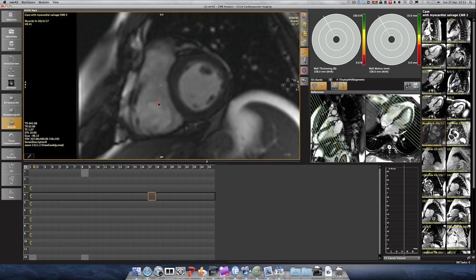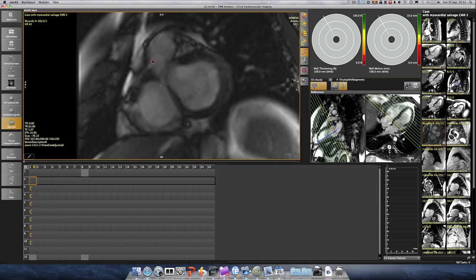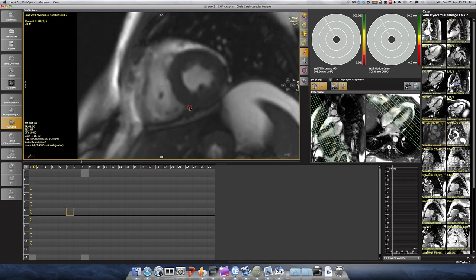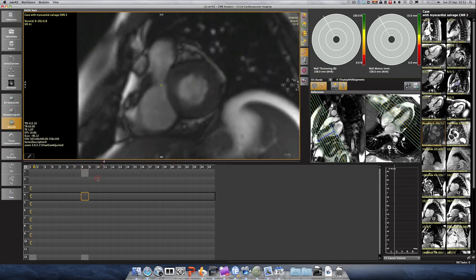Here I'll make a decision that this is our first basal slice and this is more aorta. Okay, so then we basically check where our smallest cavity is, and I look at the left ventricle. It's much easier. So if we decide this is our smallest cavity, phase 8, I go to the base.